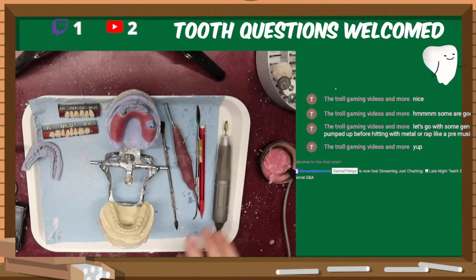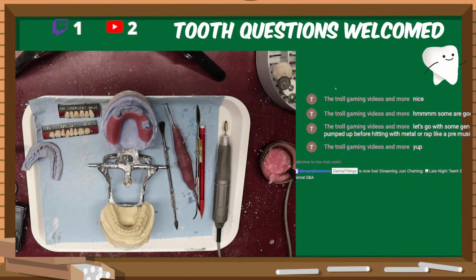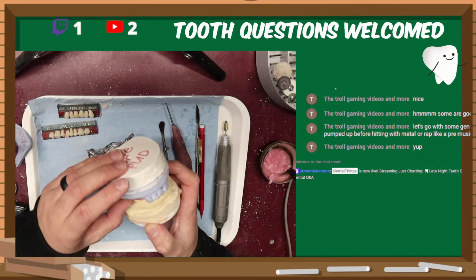Alright. Oh yeah, this gives me no room.